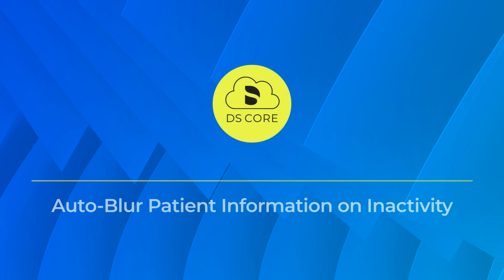The following tutorial describes how to further reduce exposure of sensitive data. DS Core now automatically blurs patient identifiers after a period of inactivity. Let's begin. In clinical environments, patient data is constantly in view but not always in use.